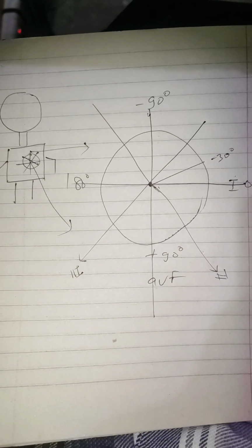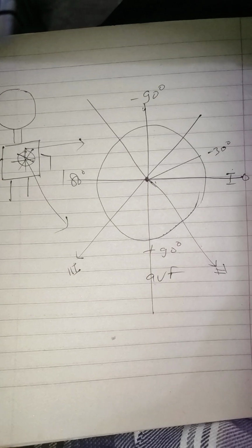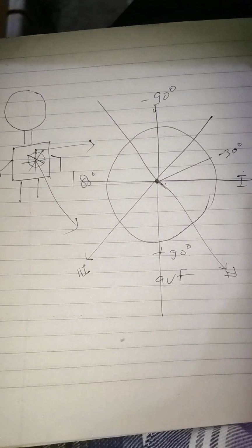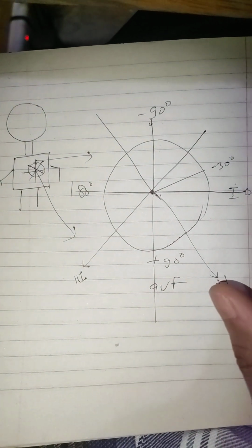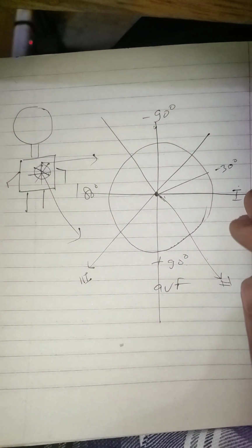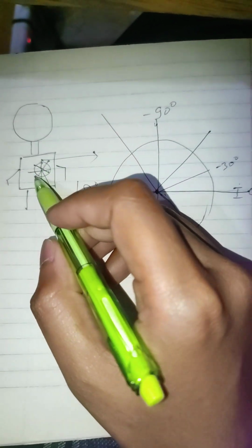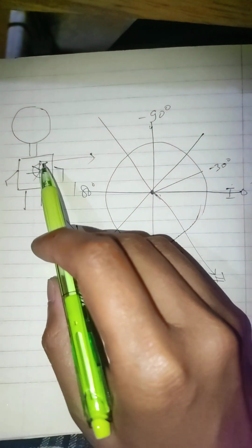How do we determine cardiac axis? I do not remember a mnemonic to determine cardiac axis because I forget mnemonics. So I remember it in picture format. Like you can see this circle and these are the axes. So I have just zoomed in on this portion here.